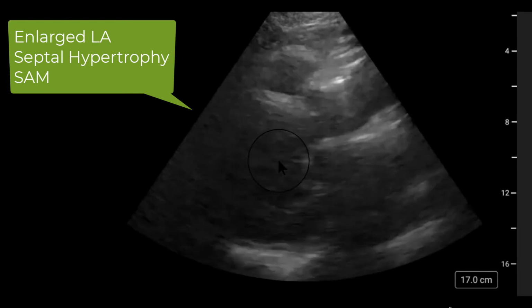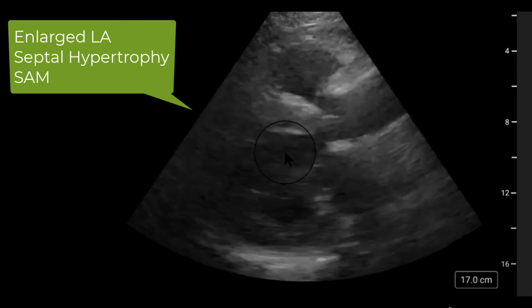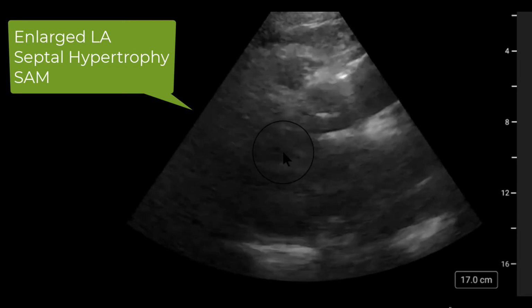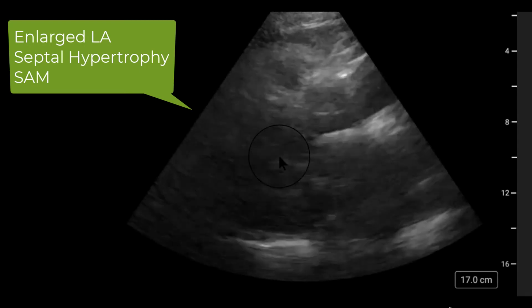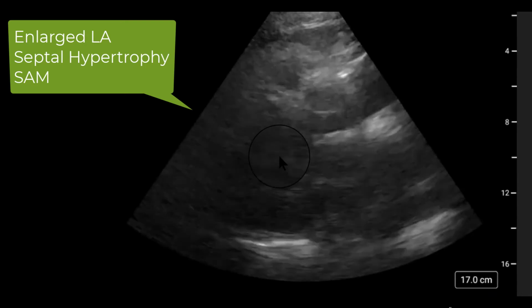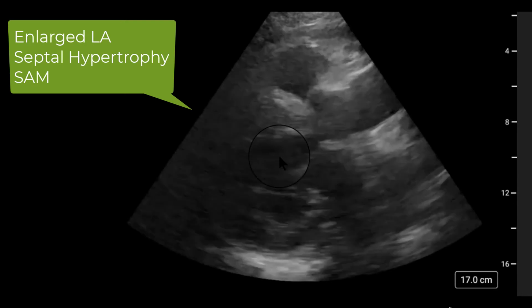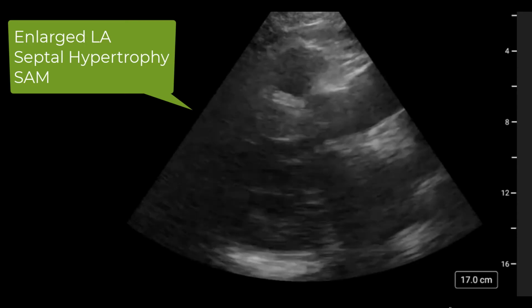If you look very carefully at this mitral valve, you can see that at some points it gets sucked into this outflow tract during systole, which implies that there is some systolic anterior motion, or SAM, present. It would have been good to have a nice color flow over that part, or maybe an M-mode through that mitral valve leaflet to confirm that.